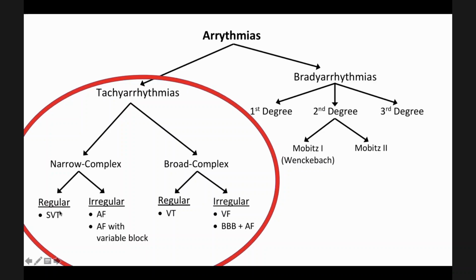So you all just keep it in as supraventricular tachycardia. Then remember the narrow complex irregular tachycardia as atrial fibrillation. This is again supraventricular, but we categorize them in a separate way as it is irregular, and also the management is different, these 2.